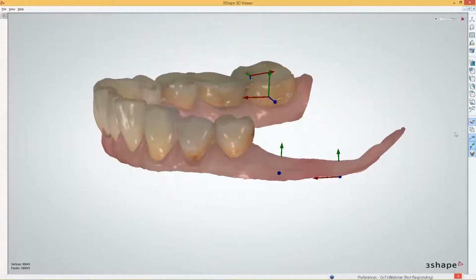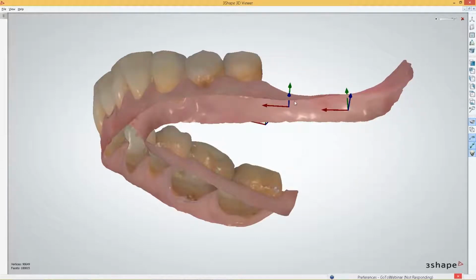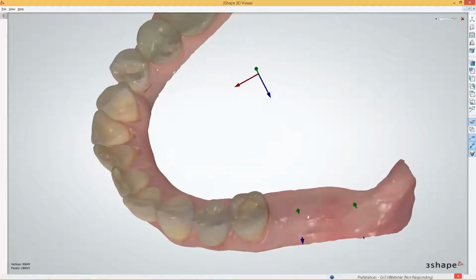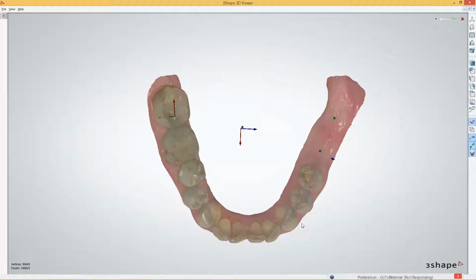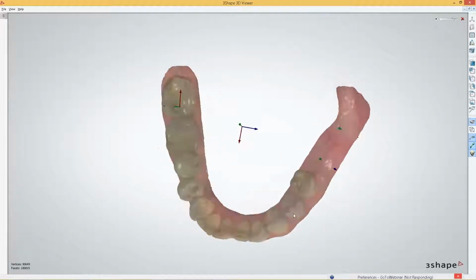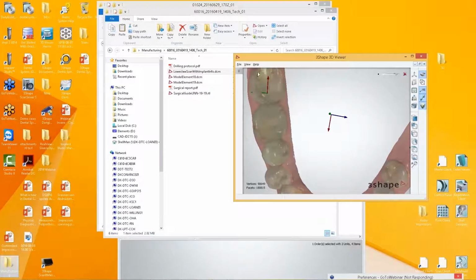And if I highlight the annotations, there are 2 markers for coordinate system for the implants. What we can do in here is just create a new order form, import this scan just like a surface scan, and select, of course, the correct implant systems. That's why if we would be sending this file, I would also recommend to send the surgical report where the exact information about the types of the implants was highlighted as well.